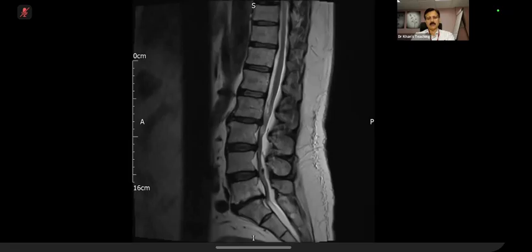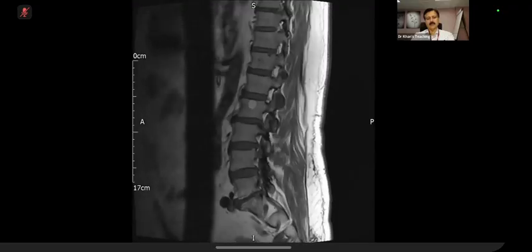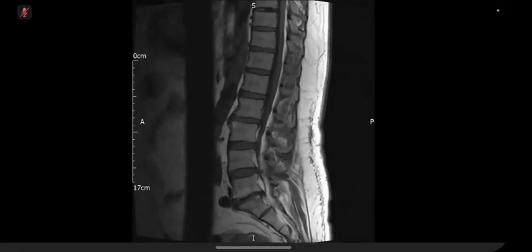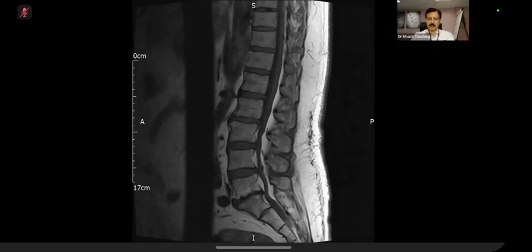Next series, please. Keep scrolling. Okay, so another T1 again. Stop. The same level where I had stopped you. What is happening? So it's iso-intense. The abnormality is iso-intense to cord. Please continue.